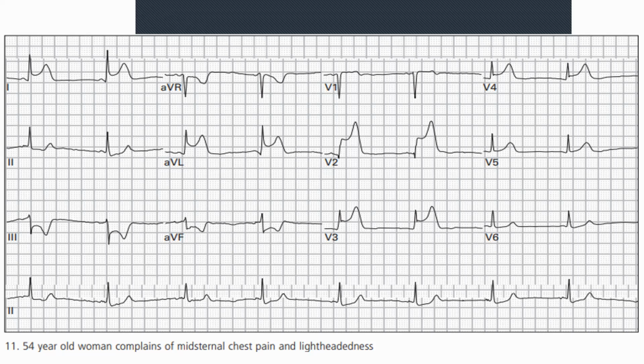Now we get into the meat of it. We're going to look at a zone. Which zone would you like to look at? Does anybody know the zones? Aha, nobody's watched those videos yet, I can see. All right, let's look at inferior. Which are our inferior leads? II, III, and aVF. Very good. And what do we notice? ST depressions. Very good.